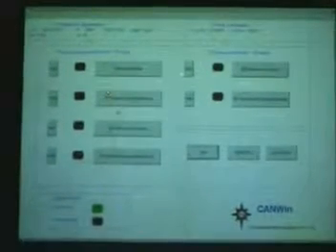Center. In this we can see the 4 tests which test for the parasympathetic and 2 which test for the sympathetic. To go into details of the parasympathetic system, the resting heart rate is first evaluated. Following this, the heart rate response to deep breathing. Following this, we go to the heart rate response to standing and the heart rate response to Valsalva maneuver. In the sympathetic test, we analyze the BP response to standing and the BP response to sustained hand grip.